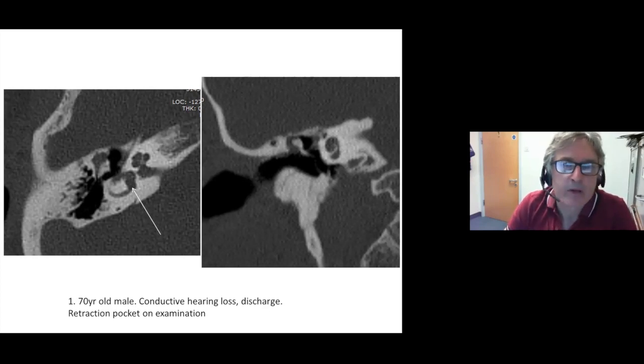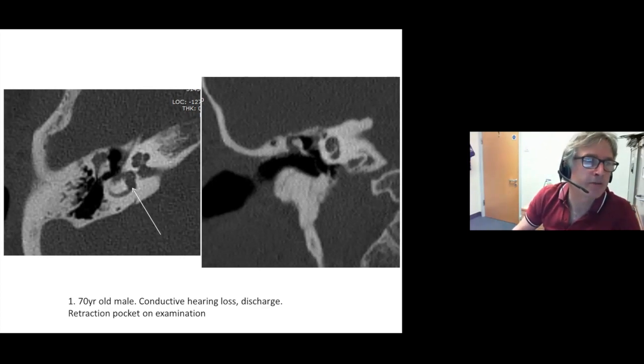So pencil and paper, you're just going to have to do these really, really quickly, 15 seconds per case. That's what we're going to go on. So you've heard of speed dating. This is speed quizzing now. Okay, so three radiological findings, unifying diagnosis and normal anatomy.